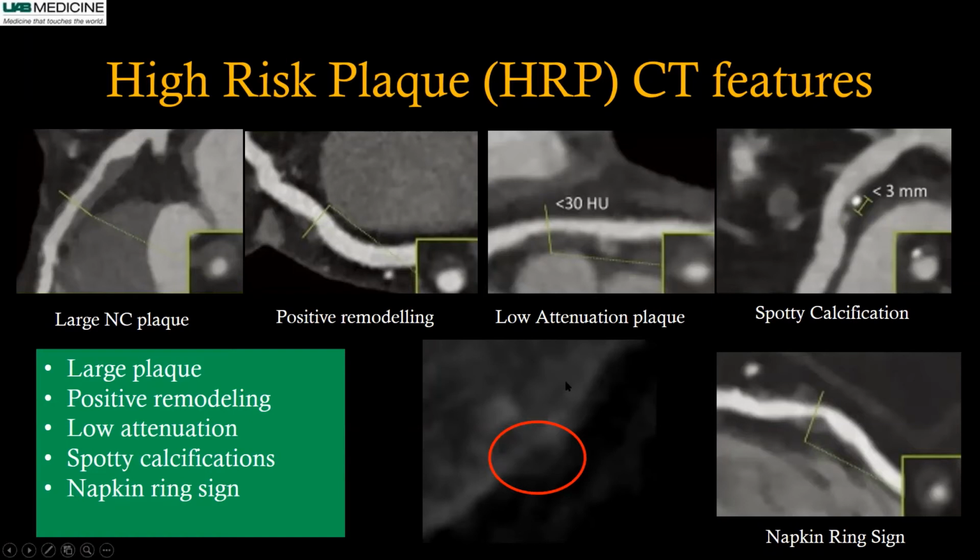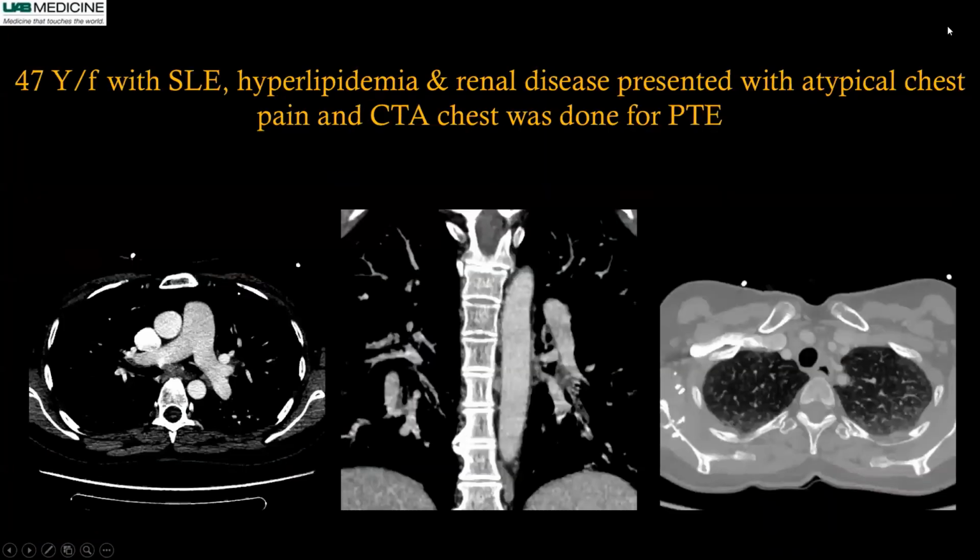This is a more recent case where we did an ED scan, no heart rate control. It was just a chest pain. And we could see some of the coronary arteries. And this is the LAD. And you can see in the mid LAD, there is a non-calcified plaque here. And there is a high density around. This is a lipid-rich plaque, which has a napkin ring sign, one of the most recently described features of a high-risk plaque. So these are the plaque features, which, if you have them, suggest that there is a good risk of further rupture and leading to a significant event.